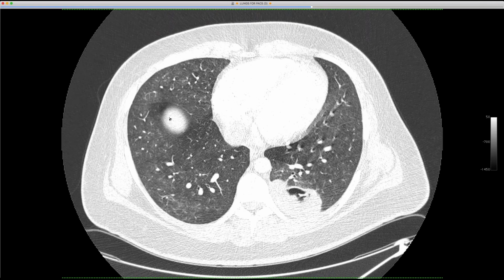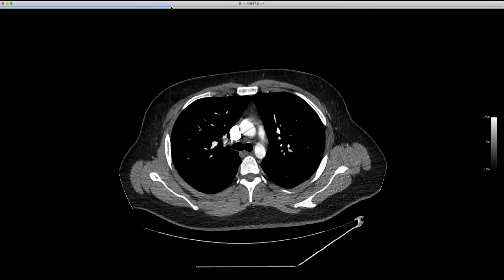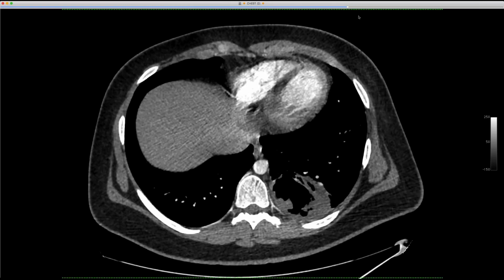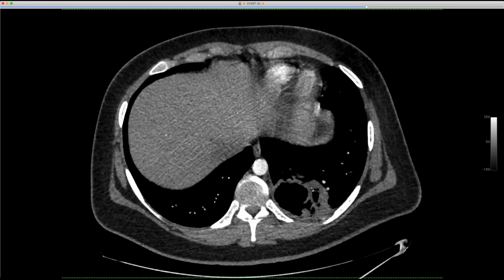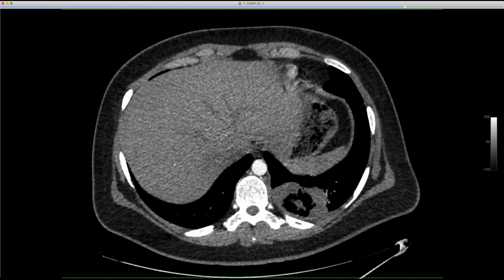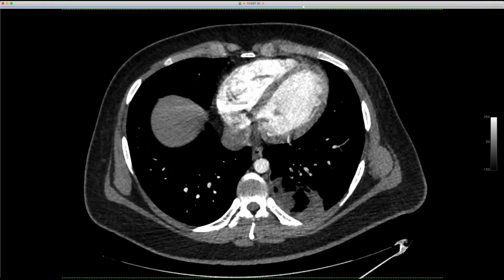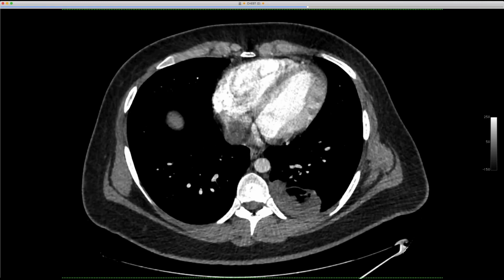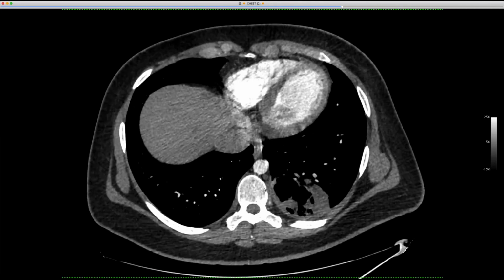So with the hemoptysis, you'd have to consider vasculitis with some hemorrhage. And I'll show the soft tissue. And no vessel going to that cavity in the left base. Well, really, there's some vessels in the wall of it, but normal-looking vessels, nothing that looks like a pseudoaneurysm. So I think David is asking about an aortic feeder. Is that what you were thinking, like a sequestration? Yeah, sequestration, yeah. Systemic arterial supply, correct.